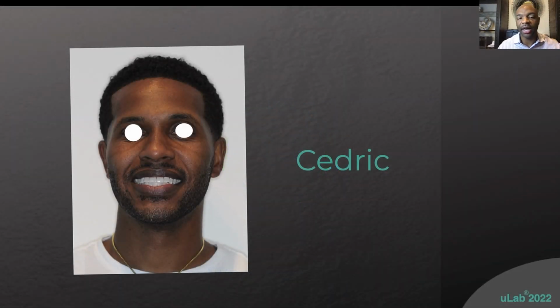Okay, and here's the last comprehensive case that we'll go over until we get into some of the other uses that I like to use uDesign for. So this is Cedric, a pastor, who came in wanting to get some work done, but he didn't want to have to be in the pulpit with braces on, which is understandable. So he wanted to fix his bite, but he wanted to do it with aligners.